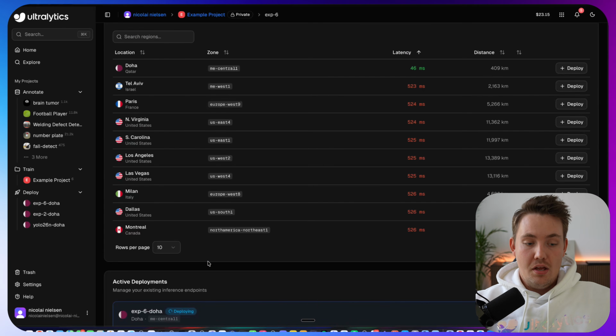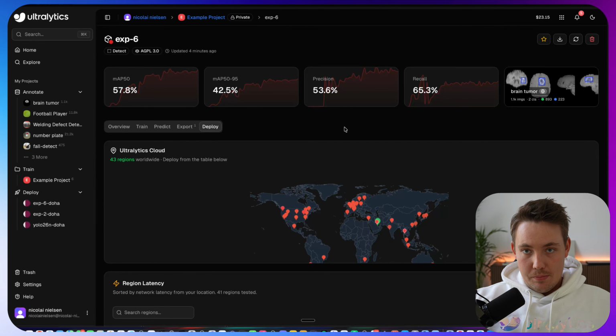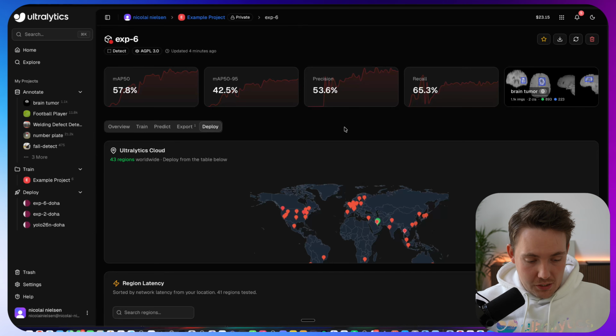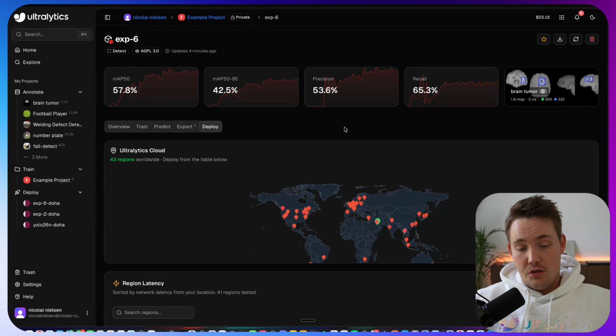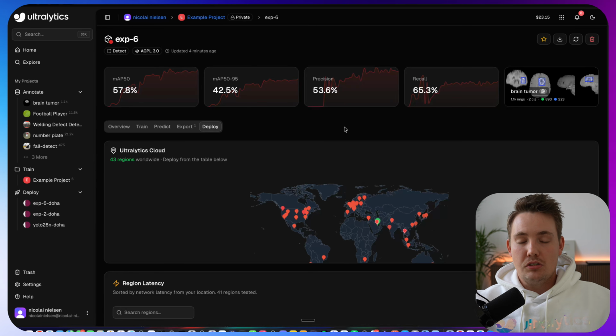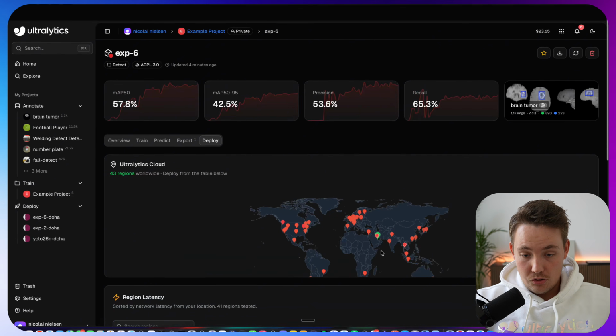This is just running CPU inference, but still the main limit here is the network latency. We will not be able to run real-time applications with a cloud-based solution, where we have an API solution as well, that will need to run on the edge. That's why we can export the models into optimized frameworks, so we can run real-time multiple streams inference on the edge. If you want to use cloud, it's just if you can do batch processing, or if you just have single images that you need to process, you can just send the images in there, get them back. You can parallelize everything. So this is some of the reasons why you would use cloud versus edge. But all these things here, we've covered those in other videos here on the channel. So definitely make sure to check those out.